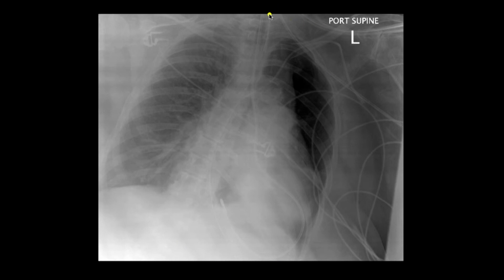But when you look carefully at the airways, this closely follows the line of the left main bronchus, and actually this nasogastric tube is coiled within the lung and not within the stomach, which is where it was intended. Obviously in this example, you wouldn't want to put anything down the nasogastric tube, which could be disastrous.